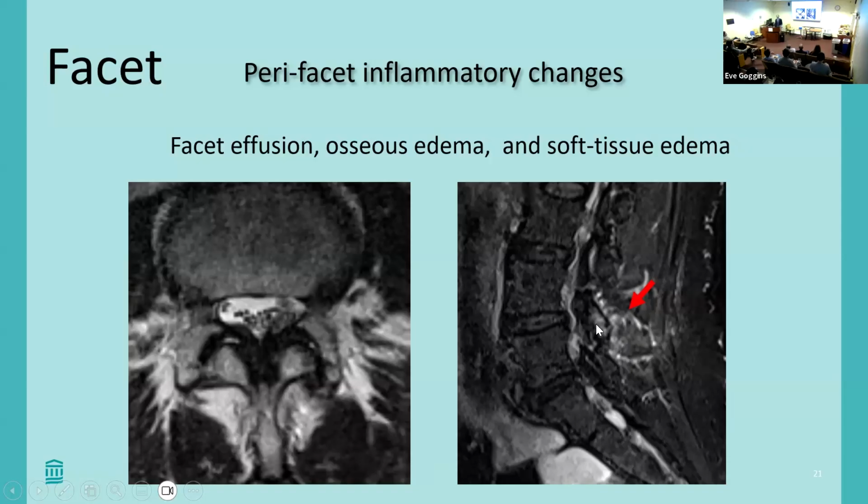No effusion in this case, but still, this should go in your impression, because depending on what they're presenting with, this could either be a sign of active facet arthropathy, which could be treated with injection, or a sign of instability. If you saw frank fluid, a big effusion, maybe with synovitis with some junk in there, maybe it's septic arthritis of the facets as well.